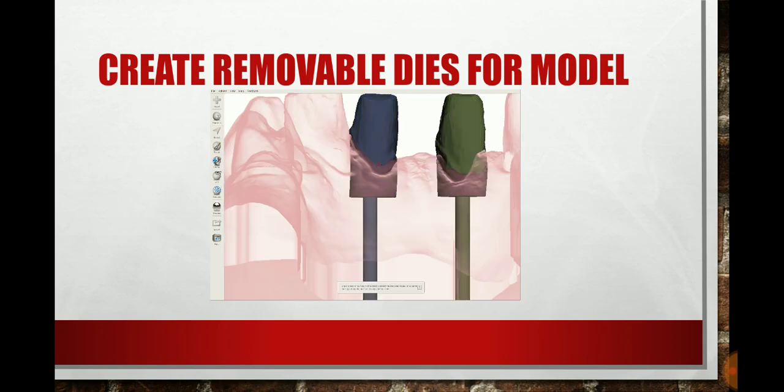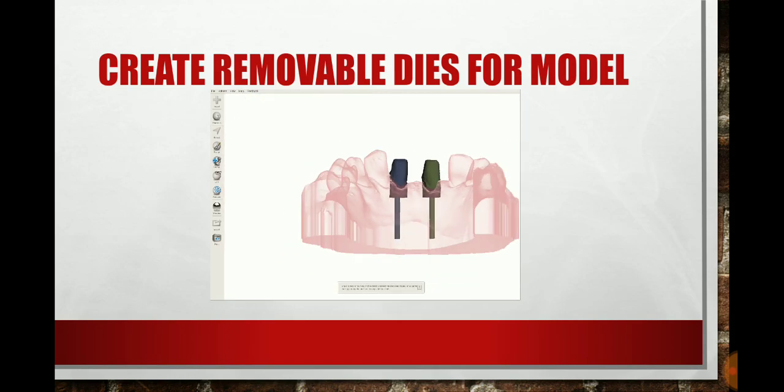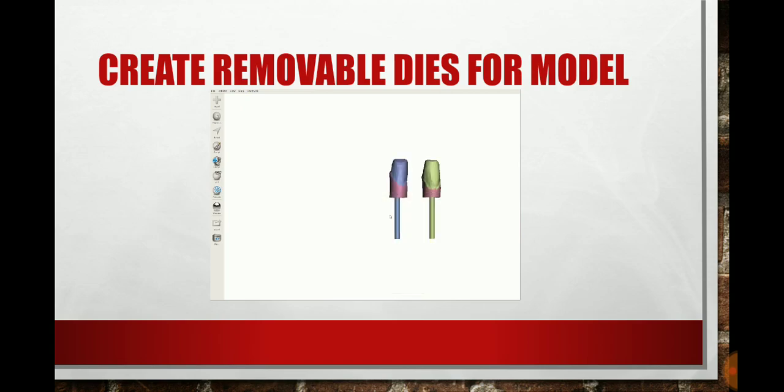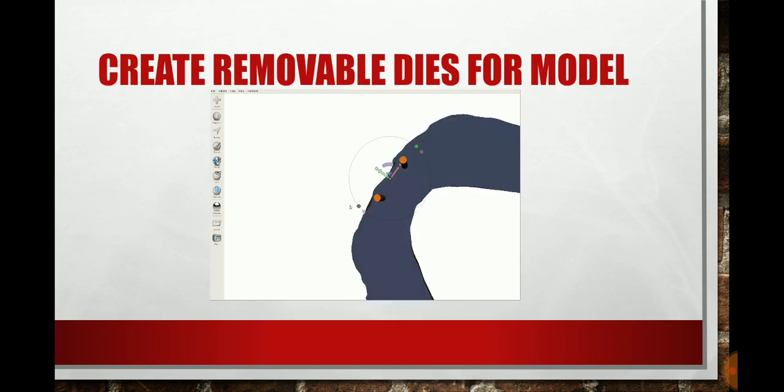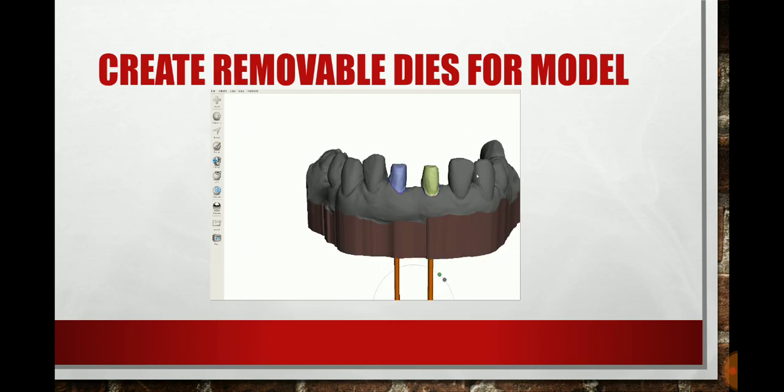Now in this instance, I think I went a little extra because usually I don't do the long pegs like this. I would do more of the prep that we pulled down initially. I would do more of that and less of the small slender circles that we drag down. But you can use this just the same.